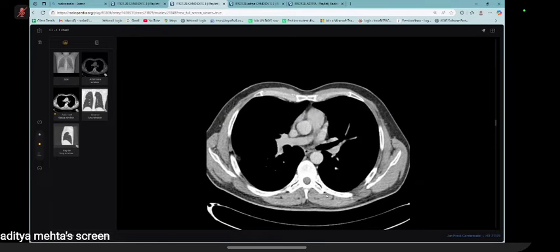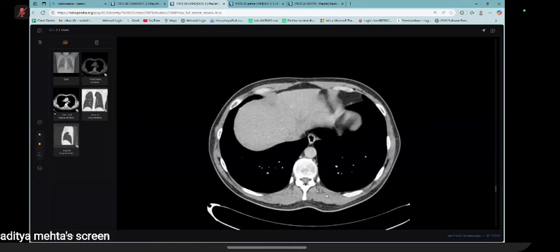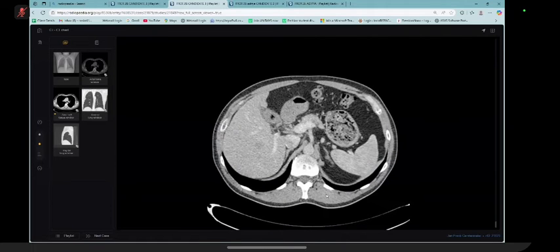And further on, I can't see anything in the abdomen, but I need the full scan to assess whether any cause related to the clinical features is there, or it's just a non-specific dyspeptic episode. That's all. You getting my point? How to manage this patient? Yes. Any doctor questions for this?